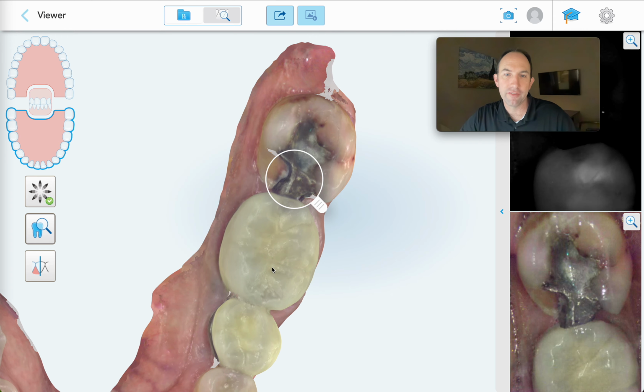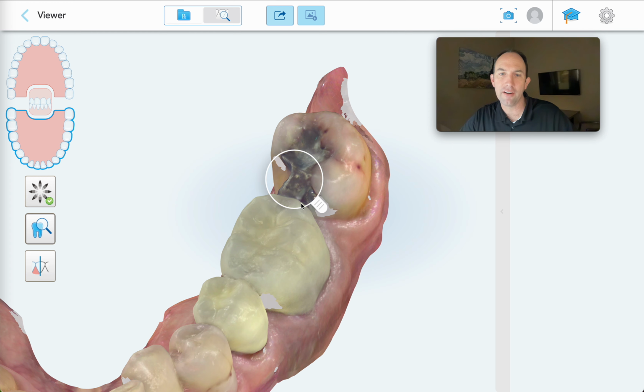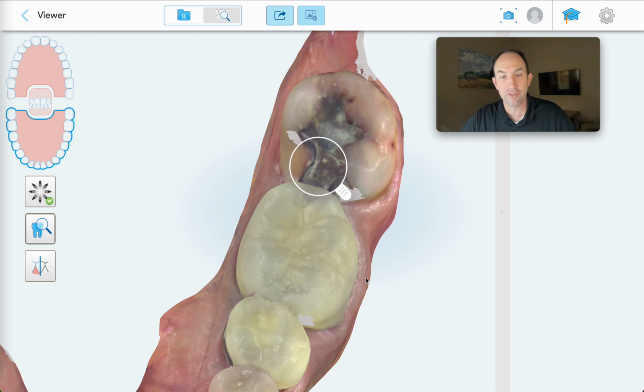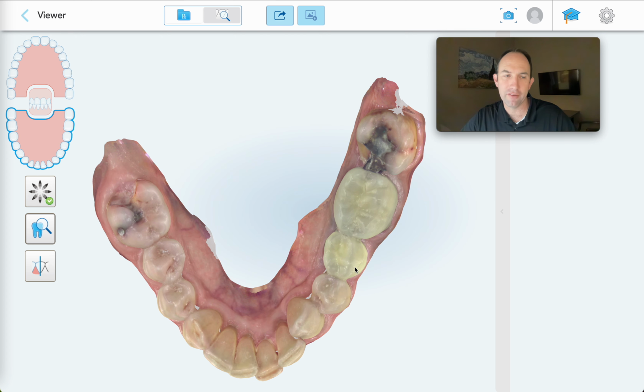Now, in some situations, the root canal is still advised based on the depth of the decay, but in this scenario, I would lead again with, we're going to need a root canal and a crown. And then if we get to the point where we don't need it, we just don't need it. And we get to save the patient that money, and they're always grateful for that.